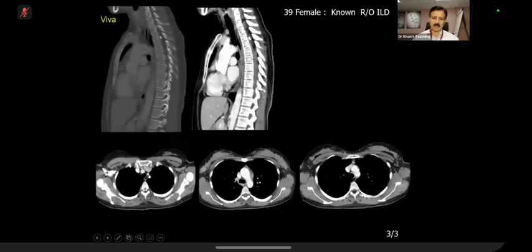So the point I am making here is FRCR exam: unusual presentation of a common finding. If I show you an MR of the spine, you will pick it up. But what you have learned now is a review area: on a CT scan, look inside the spinal canal.